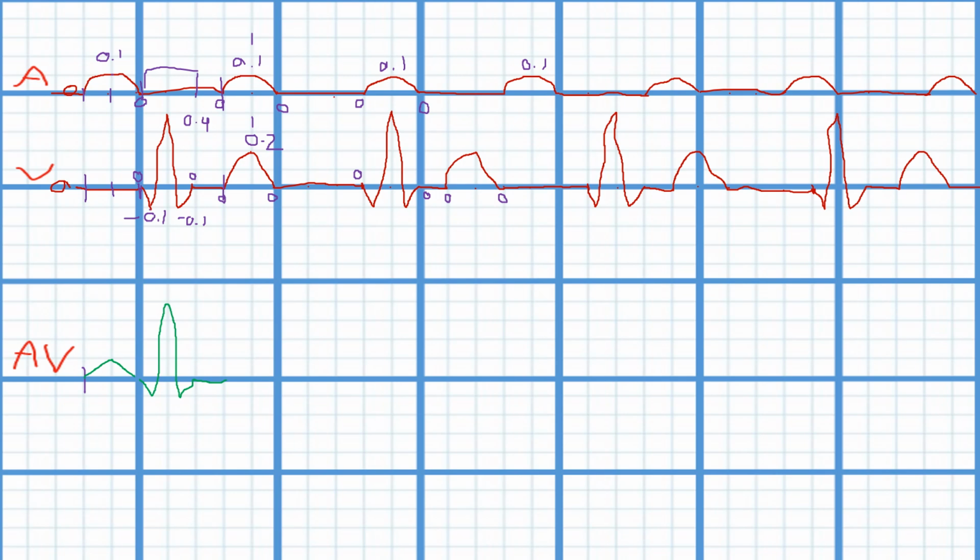And so this right here, the electrical activity is being added to each other. So 1 to 3 little boxes up. So I'm going 3 little boxes up, and now, you go 1 more box over, and once again, these are being added to each other.